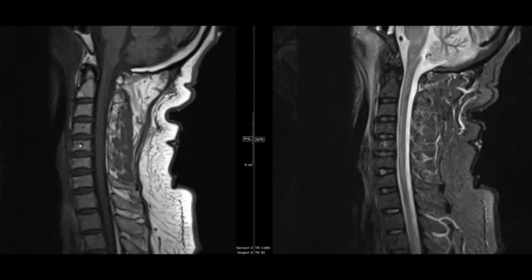It's a little bit low on T1. You have to look out a little bit more for those. It's a little bit bright on the STIR image here. Sometimes you'll just have areas of heterogeneous marrow or focal marrow there. I don't think there's anything to worry about there. This is within normal, but these are the kind of things you want to look for.